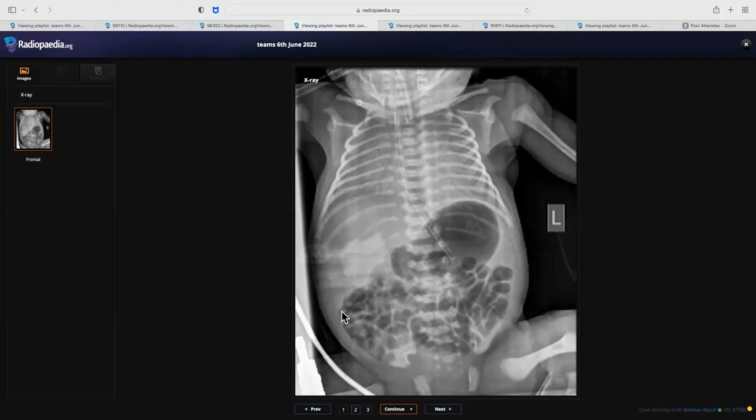not sure. You can ignore that. Okay. So there's abdominal distension also. So yeah, so the rest.